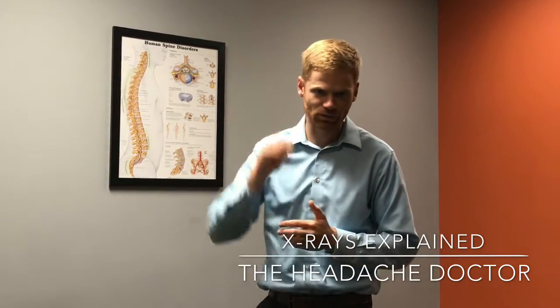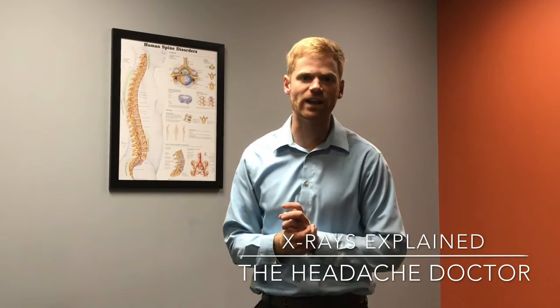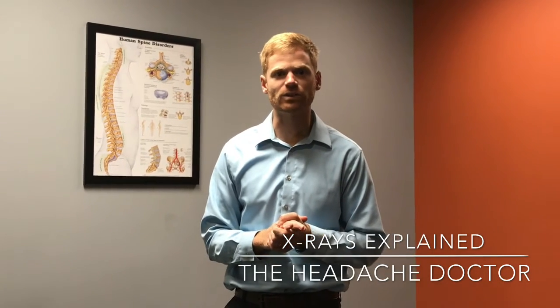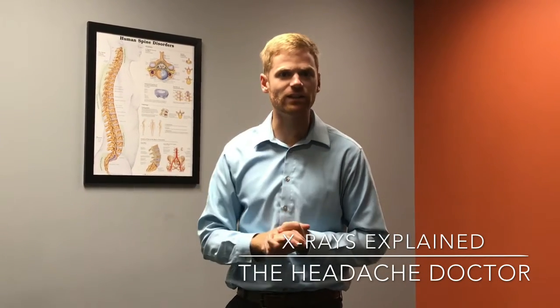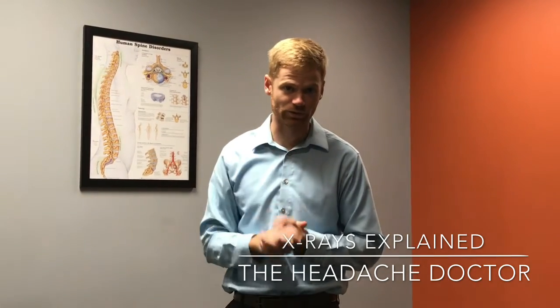What that looks like is over time, the stress through the mid-cervical spine is going to lead to these kinds of changes we see on x-ray. Now, it's nothing to be afraid of. It just means that we have to restore movement to that joint in the upper cervical spine to relieve the stress through the mid to lower cervical spine.